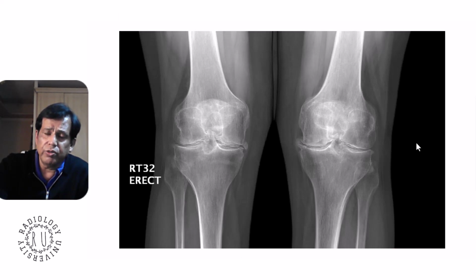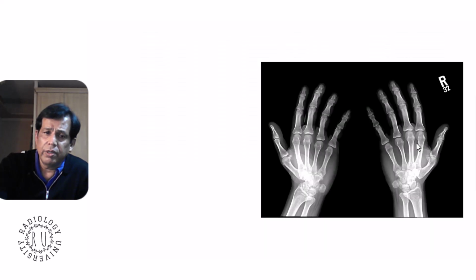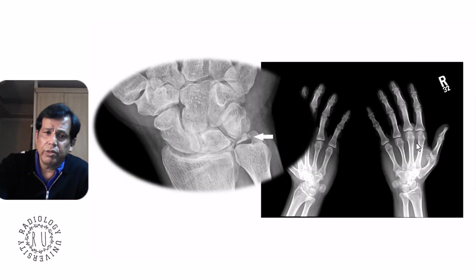Sometimes chondrocalcinosis can be age related and in osteoarthritis. Meniscal calcification. As we've seen before, you can see the TFCC, which is fully calcified. Same if you see the knee, it is very easy to see, and this is where it is chondrocalcinosis.